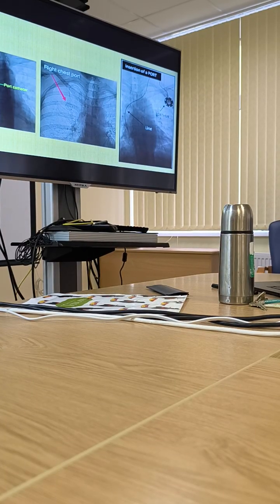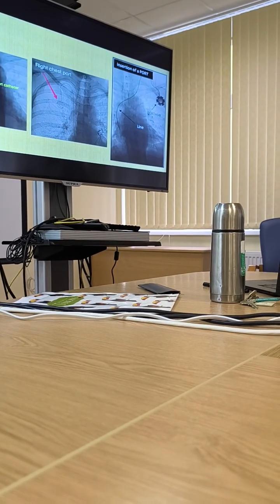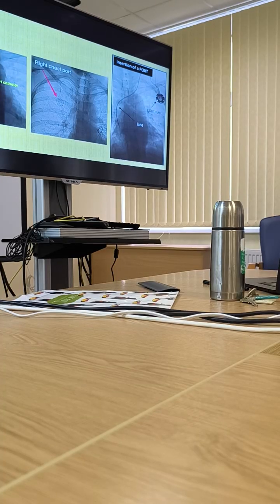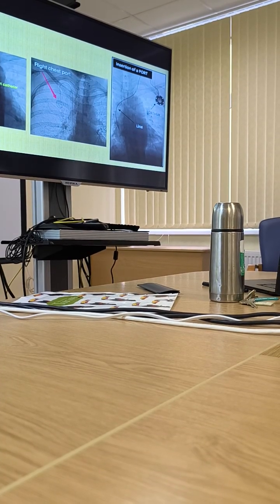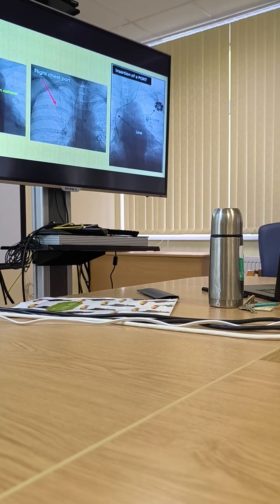And these are the ports I've told you about, the ports which we use for long infusions. And you see all the pictures, they are positive images. The metallic parts from the bones are really in black color, and the lungs are in white color.